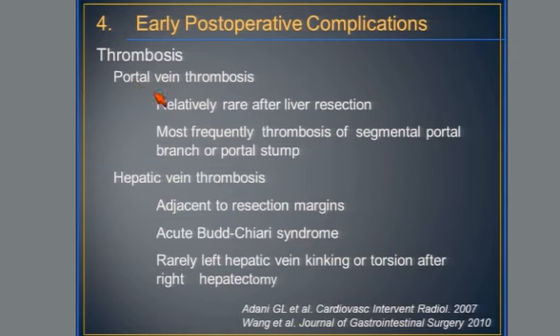Thrombosis can be observed after liver resection. They are relatively rare after liver resection compared to orthotopic liver transplantation. And most frequently, thrombosis involves segmental portal branches or the remaining portal stump after liver resection.